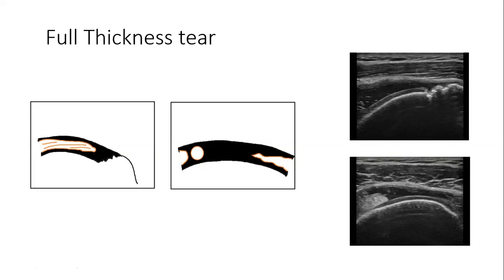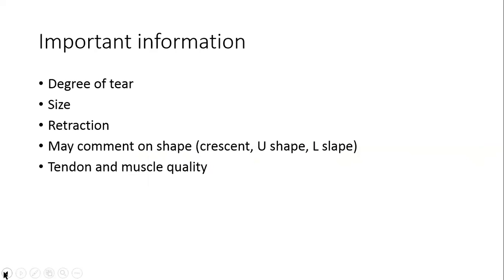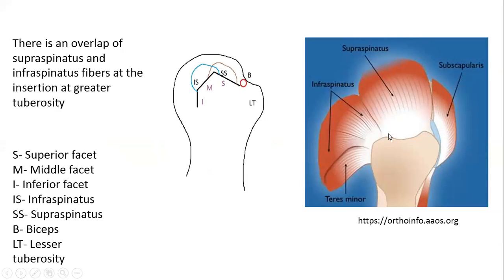Make sense? So if you think, let's say there are 10 tendon fascicles attaching to the greater tubercle. So that's the long axis. In short axis, actually, let me go back and I think it's going to make sense here. Oh, right here. So this is supraspinatus, right? So let's say there are 10 fascicles. If we count 1, 2, 3, 4, 5, 6, 7, 8, 9, 10, from here to here, 10.